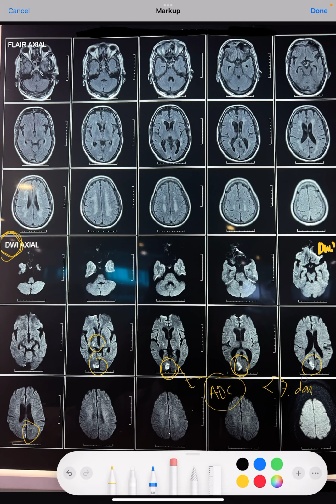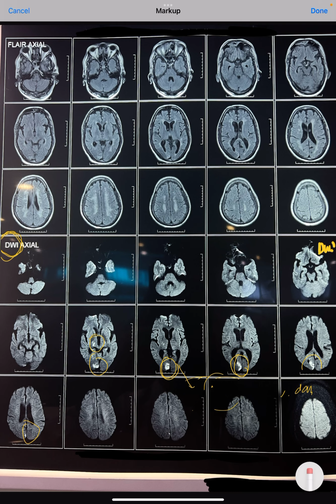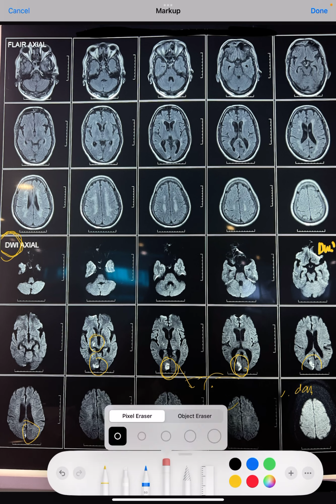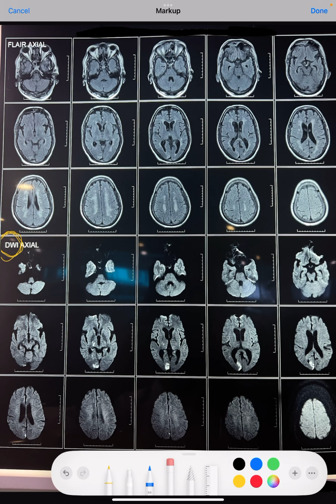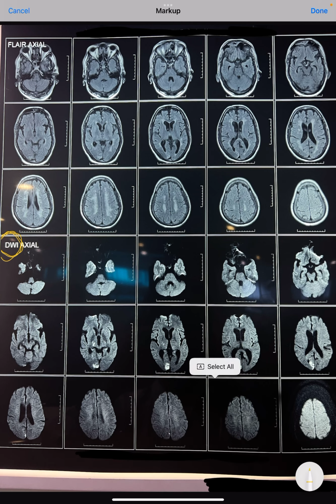So, in here, what we are saying is that the patient is having acute ischemic stroke, and this is involving the posterior circulation. Posterior circulation, this is the occipital lobe, where there will be involvement of vision, and most of the time the patient will have homonymous hemianopia, meaning only one side of the vision will be lost.